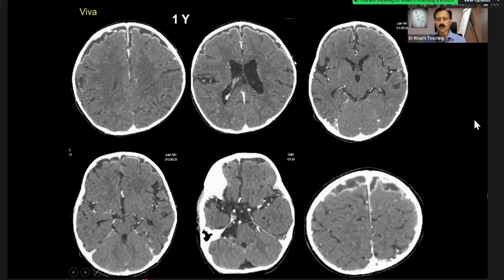This is a case of meningitis. And you can see that there is enhancement of the surface of the brain, which is what we call the pia mater. So leptomeninges, something which dips down the sulci, it has to be leptomeninges. But here is a space which is the subarachnoid space. And if you look carefully, because we have given contrast, there is enhancement of the vessels, normal vessels.